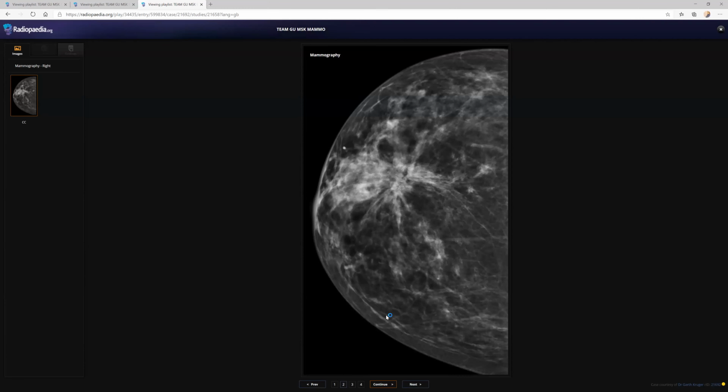This is a spiculated mass noted in the center. There is one large calcification noted in the outer quadrant, likely to be a benign one. Leave it. No skin thickening, and the nipple is not normally visualized, maybe it is retracted, but no skin thickening is visualized. To me, this is BI-RADS 4. I would go for the triple assessment.